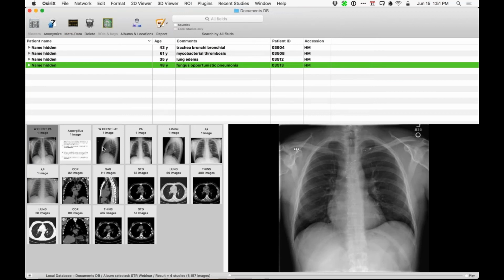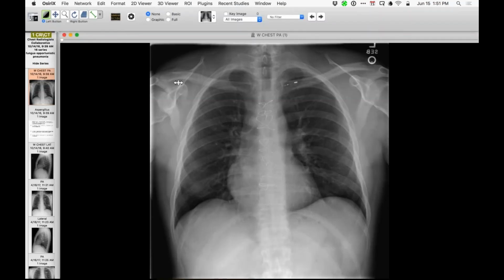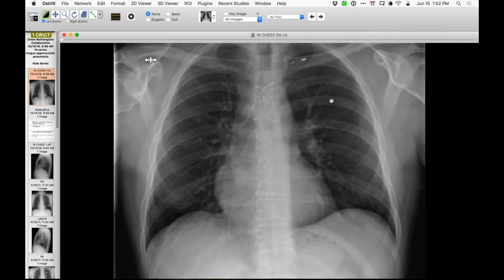Okay. One of the clues for those of you that, I don't know how often you see this, but one clue, if you look at a post-op image and you have no context whatsoever, but you see sternal wires, and then you see fragments of pacemaker lead, that's the hint that the transplantation was the etiology. So sometimes when they have a CRTD device prior to transplantation, and at the time of cardiac transplantation, they remove that and or the LVAD, but sometimes they have difficulty removing these at the time of transplantation. So that's often, to me, a hint.